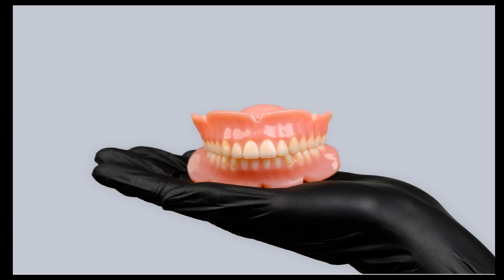As usual with shade assignment, go on with making the entire tray and mixing different shades inside the same arch as much as possible, same as we did with the basic shades. We cannot mix basic shades and True Voxel shades, but an A1 and an A2 with True Voxel shades can live in the same denture. Now, after you're happy with your assignments, if you want to go back to a basic shade, just as before, select one tooth or more and switch to the basic shades and select the relevant shade you want to switch to, and it's going to switch the entire arch.